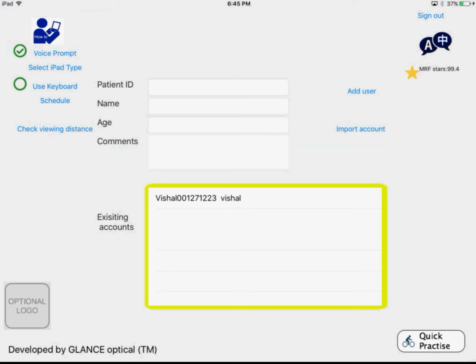Before I get into the other things here, I just want to say, normally one of the most common questions we get is, how can full threshold visual field testing be done on a tablet, because the screen is small. So the answer is that the full threshold visual field testing up to 30 degrees from the fixation point is achieved on a standard tablet, which is 9.7 inches or larger, let's say 10.5 inches or 12.9, by patients changing their fixation to 4 corners of the tablet, following the fixation marker when directed during the test.